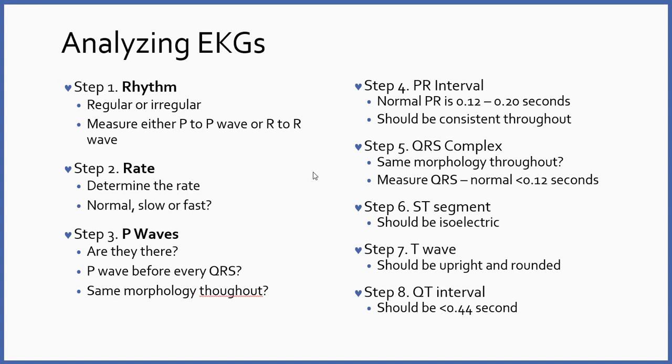Now, analyzing EKG isn't hard, but it's something that takes some practice. You're pretty quickly going to get to the point where you'll recognize most rhythms by sight. I could guarantee pretty much all of you are going to be able to pick up on asystole, for example. Sometimes, though, you see a really wacky EKG and you work through the analysis and you come up with something, and then you hand the strip to somebody else who interprets it differently.